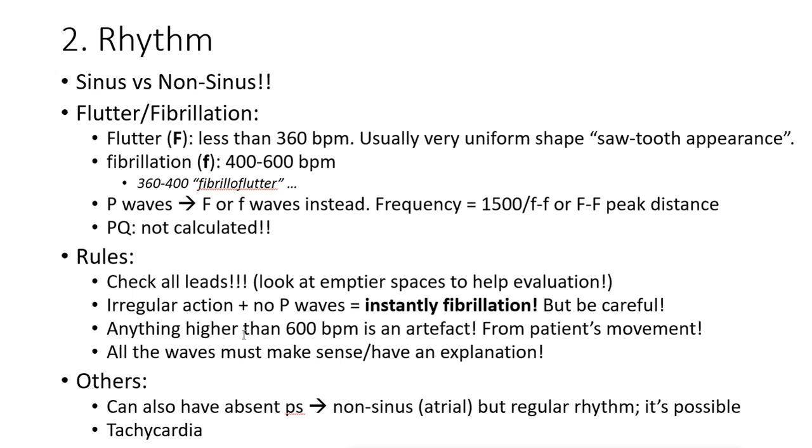And you don't fall for the idea that, oh, I see fibrillation. Check first its frequency. If it's more than 600, it's probably not fibrillation. It's probably just the patient's movement. Also, with the patient's movement, you'll notice that this so-called fibrillation is found throughout the whole ECG, everything.